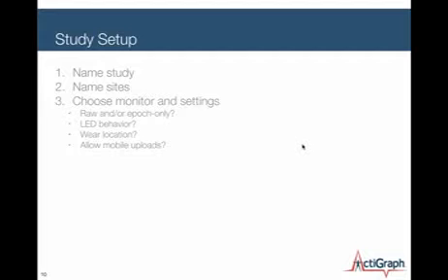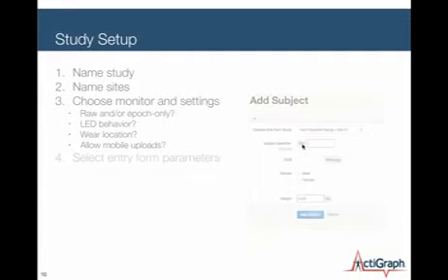All these configuration parameters are things that typically you would be required to train your site on. So if you were using ActiLife in a multi-site configuration scenario, you would have to contact all of these sites and explain to them, hey, we want the LED to flash when it's collecting data, but not when it's in delay mode. And you'd have to explain what delay mode is. All of these are pre-configured in the study admin system by you, the coordinator, so that there is essentially no chance for error in setting a device up. So you'd set those options up.